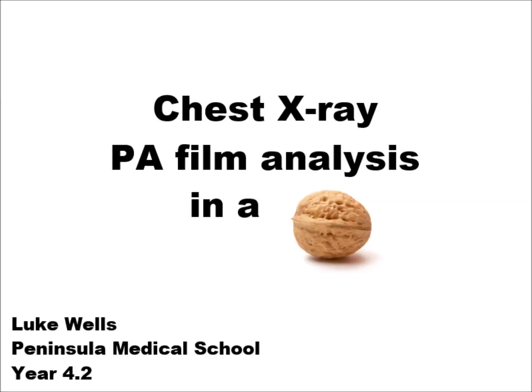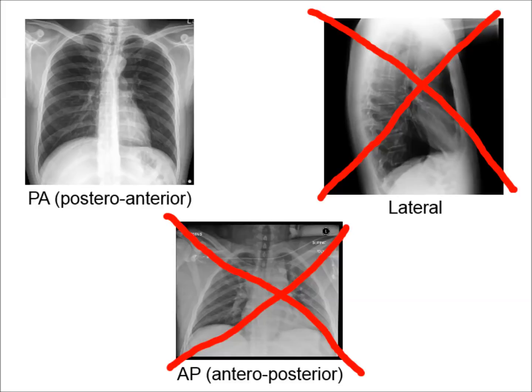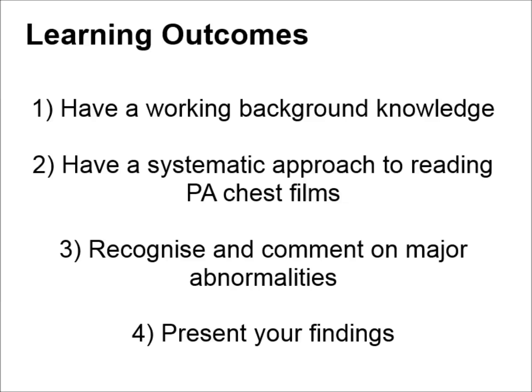PA chest radiograph. Reading a chest X-ray is a vital skill for medical students and doctors, and often comes up in exams. While there are other chest film views, PA is the most useful and by far the most common view you'll encounter, so this is what I'll be teaching in this short video. As this video is teaching the skill of reading a chest X-ray, I will not cover the more advanced skill of how to diagnose particular chest pathologies.